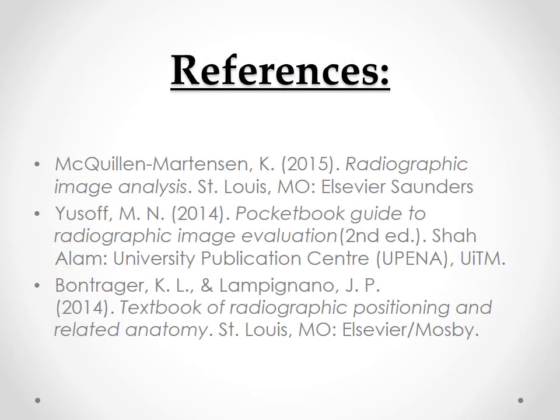In the next section, we will learn how to analyze the PA chest X-ray based on the Paceman method.